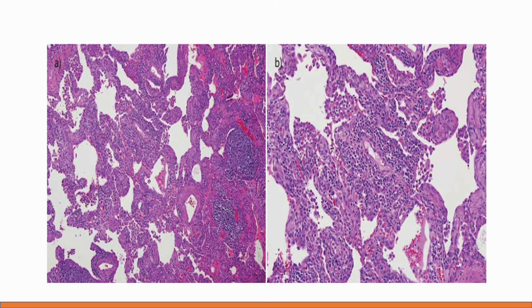This is the histopathological image, the HE stain, and what it shows is a lot of alveolar infiltration, an interstitium which is infiltrated with lymphoid cells and lymphoid aggregates. These lymphoid cells are lymphocytes, with some plasma cells, and the diffuse infiltrate of lymphocytes and plasma cells extends, expands and distorts the septa, and it also has a lot of reactive lymphoid follicles. What is the distribution? Bronchovascular or lymphatic.